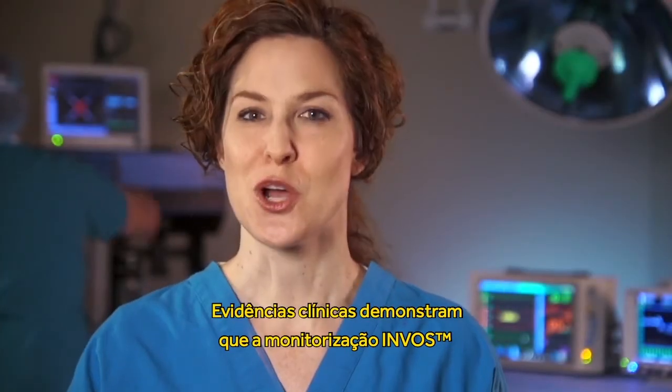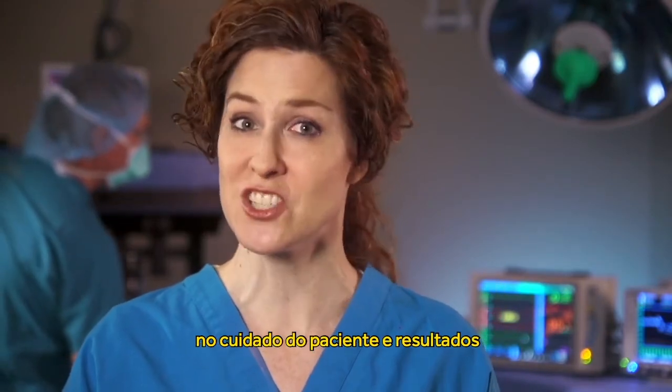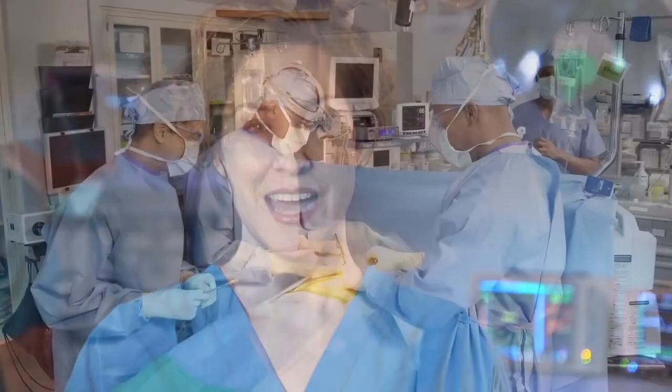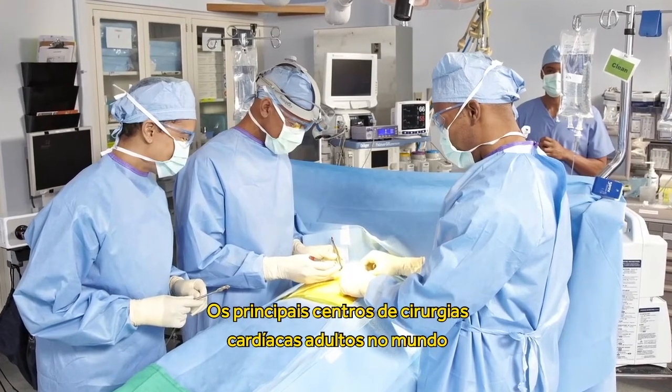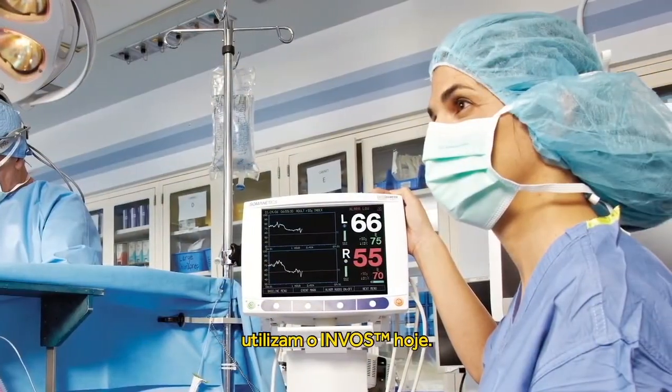Clinical evidence has shown that the INVOS measurement can have a profound impact on patient care and outcomes. A majority of the top adult and congenital cardiac surgical centers are currently using the INVOS system today.